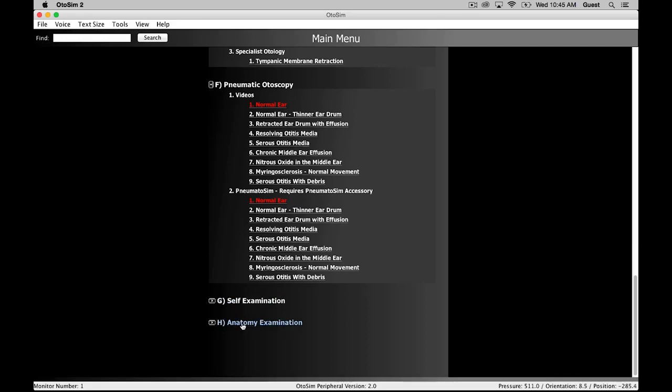and the anatomical quiz section. In the self-examination, we have a bank of over 250 questions, and we have a standard quiz and a comprehensive quiz.